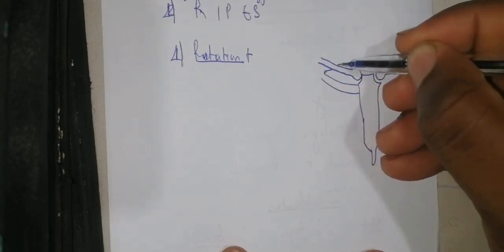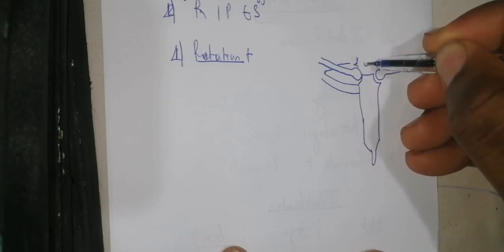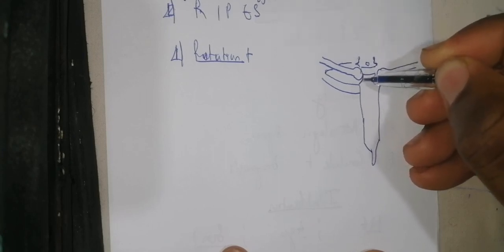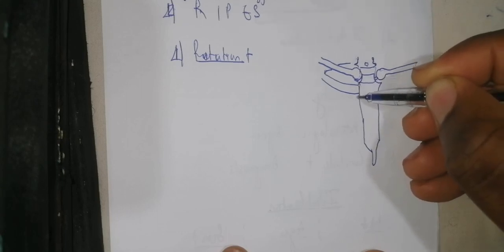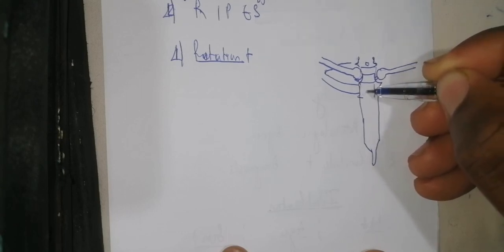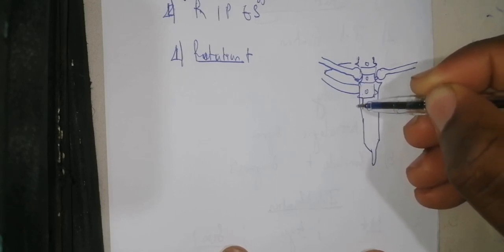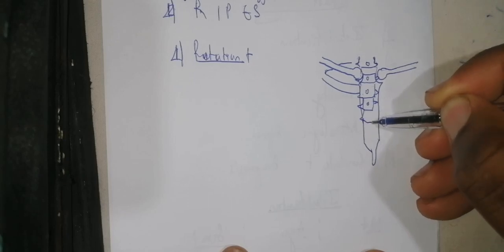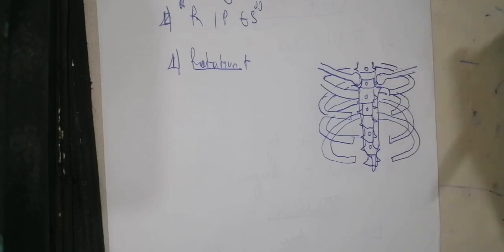You start from posterior. You have the different vertebrae, and you have the spinous processes of the vertebrae that can be seen. You can see the shadow of the vertebrae behind with their spine. So that's the diagram of your X-ray. So let's say that your X-ray is this.